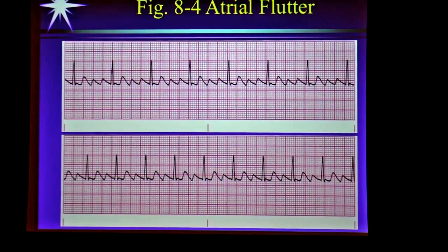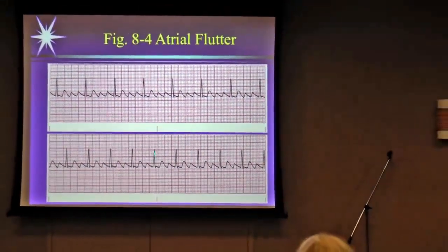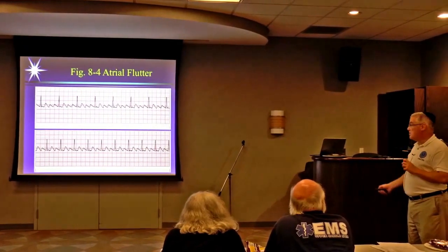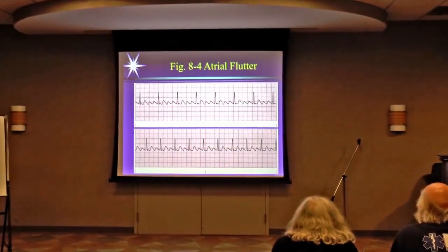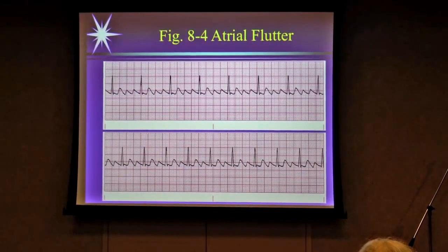So what's happening here is that, again, certain parts of the heart are firing, and how fast the heart rate is depends. So you could have atrial flutter where every flutter wave contracted through. Right now this heart rate is 1, 2, 3, 4, 5, 6, 7, 8. And let's say there's 2 flutter waves in front of every one. So it's 80. That means only one is conducting. If both of them conducted, the heart rate would double, so it would go to 160.